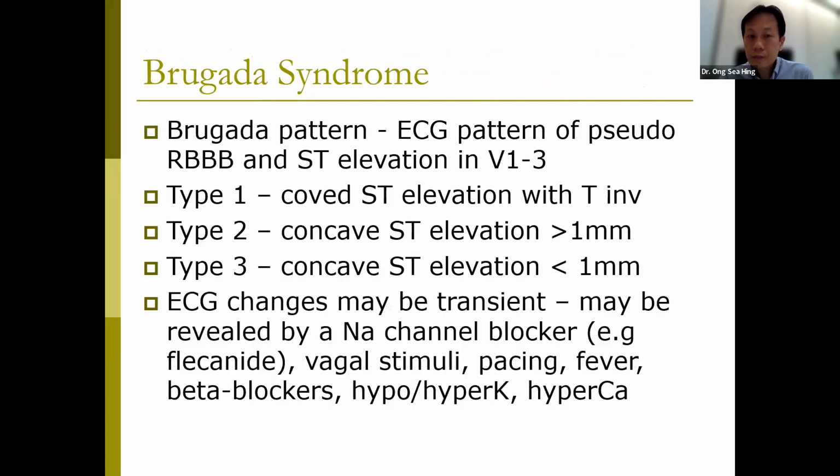Okay. So what is Brugada syndrome? I'm not sure whether this is common in Myanmar, but we know it's quite common in Thailand. It's not as common in Singapore, but we still see it once in a while, especially the type 2. So the Brugada pattern is basically an ECG pattern of pseudo right bundle branch block with ST elevation in V1 to V3. And it's called Brugada because it's described by the Brugada brothers.